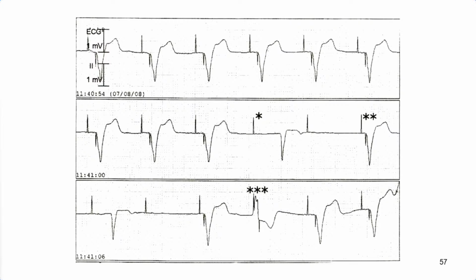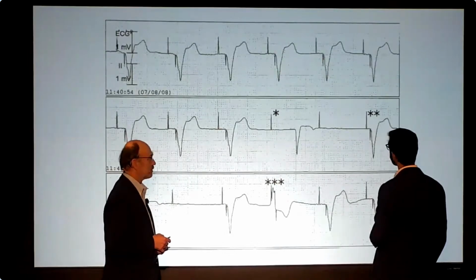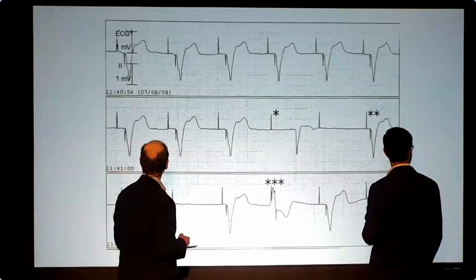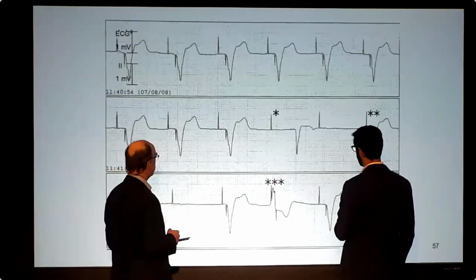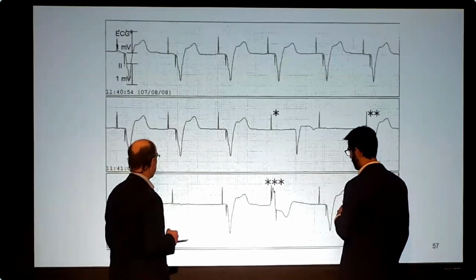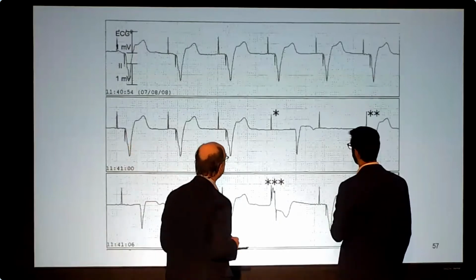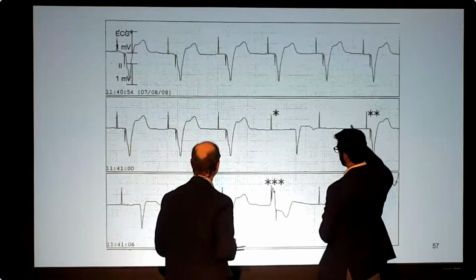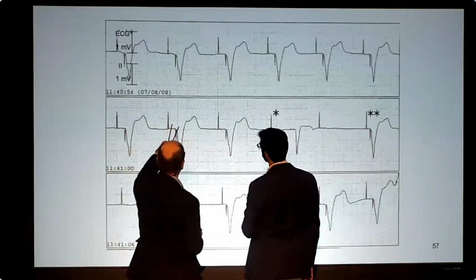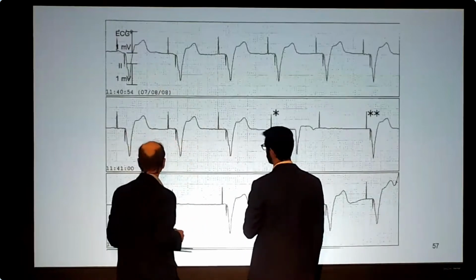What's really nice about this, from a practical point of view, is that on the ECG you see the atrial spike is big, the ventricular spike is big, and they're in different directions. Makes life a little easier, doesn't it? If you just had the ECG. So I think I'm using this term correctly, I think this is hysteresis to see if we have AV conduction in some sort of ventricular pacing reduction algorithm, MVP, VIP, whatever. And so we have A pace, V pace on the top strip. Perfect. With capture of the atrium and capture of the ventricle, even though the P wave's very small, but I'll take your word for it.